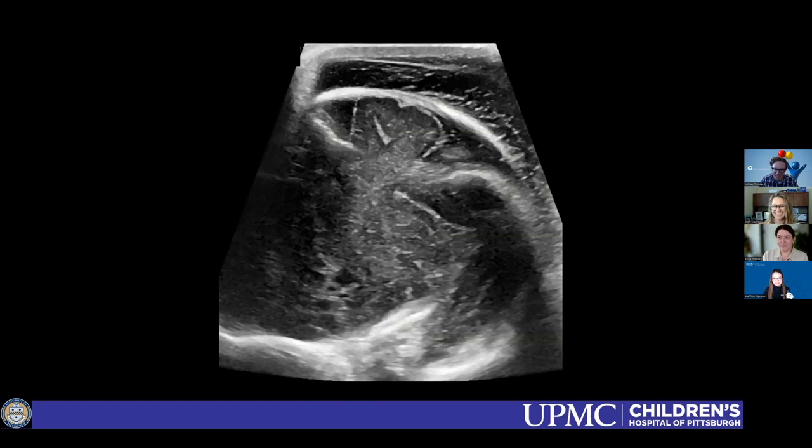Thank you. Yeah, we had an almost identical case about a month ago that ended up being a calcified cephalohematoma, but the ultrasound appearance was very odd. It was similar to this. It's definitely confusing. So yeah, the scalp stuff can definitely distort and give you all these weird artifacts.